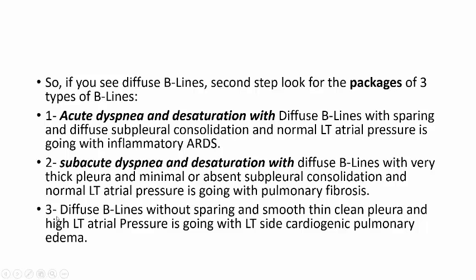But if you have diffuse B line without sparing, with smooth, thin, clean pleura, and high left atrial pressure, this will go with left-sided cardiogenic pulmonary edema.